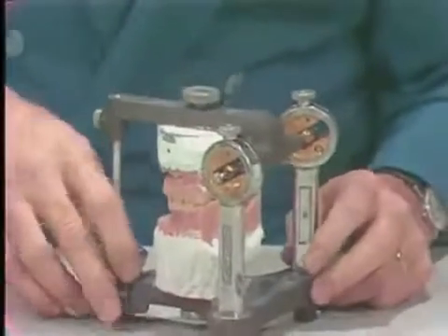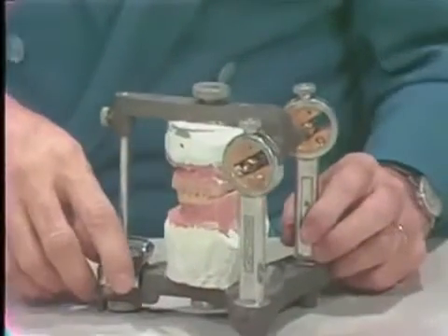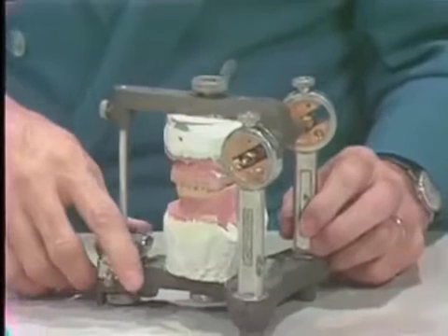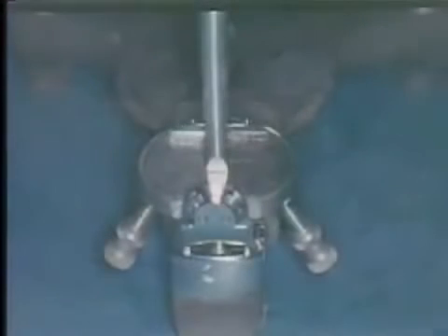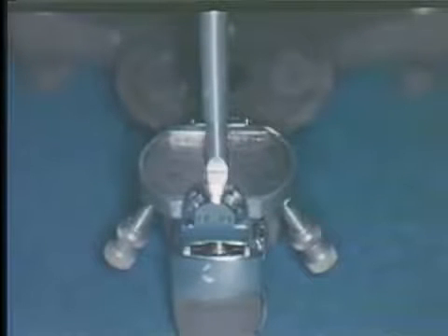Now in order for these things to work right, you have to initially have your articulator set properly. And we'd like to talk to you about the setting first before we check the articulator, and we want to adjust the incisal pin. As you can see now, we would set your lateral movements on 15 and your condylar elements on 30. And then if you notice where the incisal pin is, it has to be dead center in the incisal table. If it isn't, of course, then all your other movements would be incorrect.